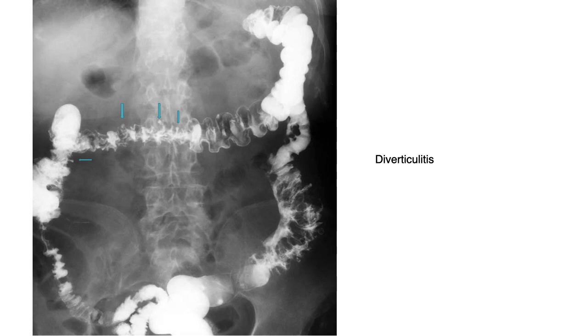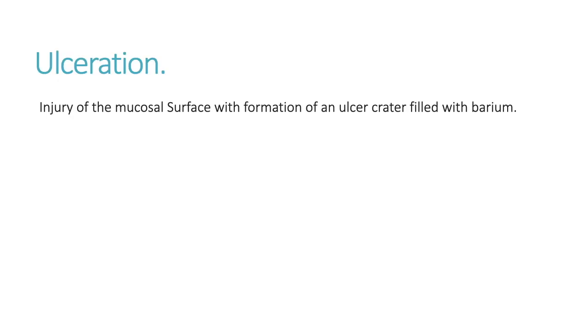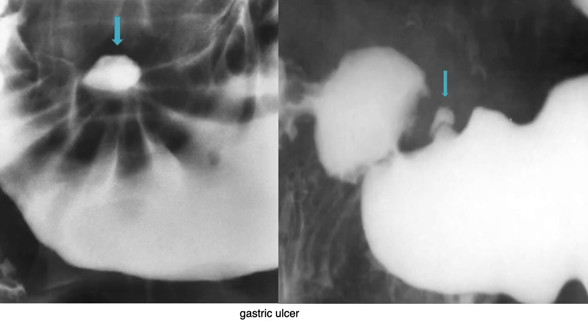Now the fourth terminology is ulceration, which is an injury of the mucosal surface with formation of an ulcer crater filled with barium. You can see it in this picture.